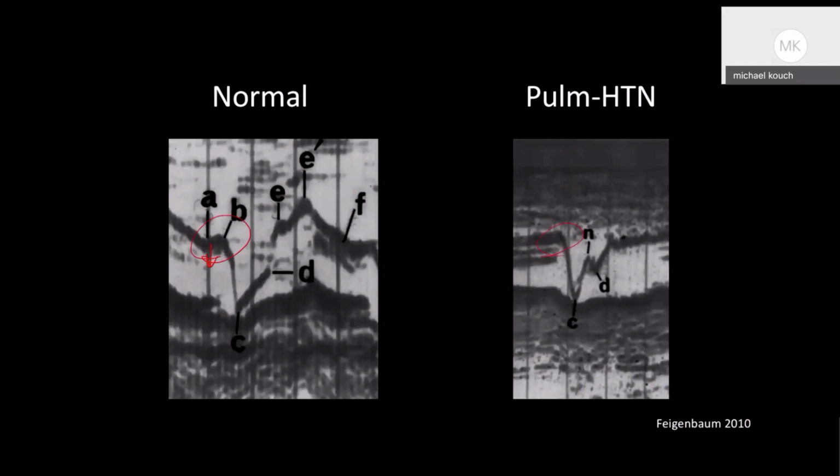And we lose that here. We don't see that, okay? For some reason, during mid-systole across your pulmonic valve, you see that that valve starts to move backwards. And that doesn't make a ton of sense, right? Why do you think that would be? And this is hard. I want you to try to think through this because this is a really important finding in the setting of pulmonary hypertension, but it's very difficult to determine why it happens.